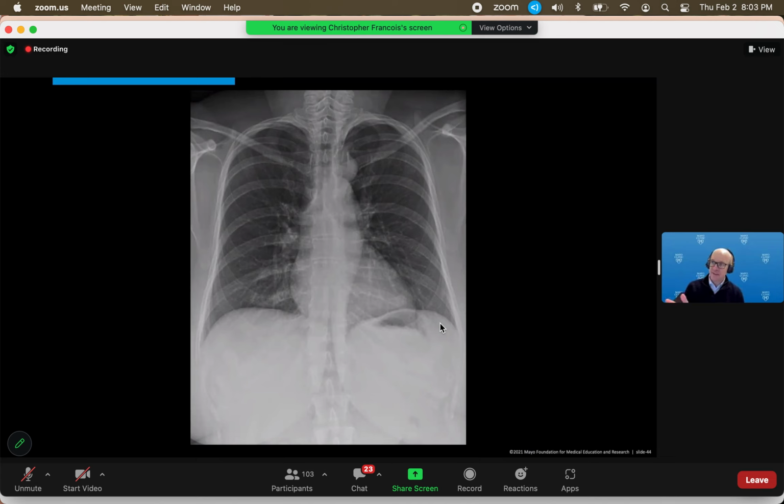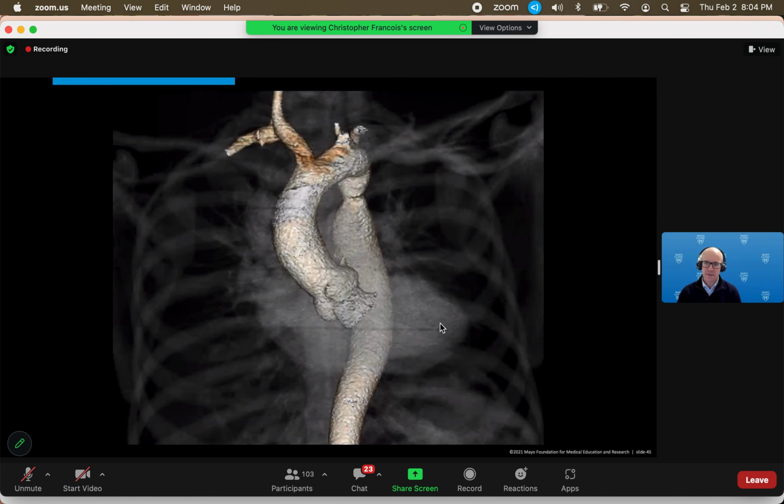But we also have vascular structures back there, and this is a cardiovascular case conference, and so it's most likely going to be that. But to kind of figure out what this is more definitively, what would you recommend? Oh, cross-sectional imaging for sure, CT or MR, and along the cardiovascular differential, what would you consider, Usama? Yeah, aberrant right subclavian. Okay, sure, that's a possibility. With a diverticulum of Kommerell, it's aneurysmal.